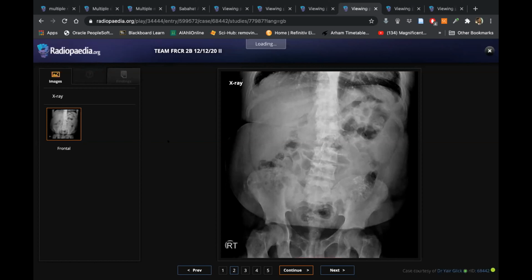I would like to correlate with whether the patient had a transplant before. No, I'm not giving you, I'm the mean examiner. I'm not giving you the history of transplant, but there's a calcific focus here in the left hemipelvis. And the patient, in the history, they told you renal osteodystrophy. So what can it be? I would assess with ultrasound to look for any calcified renal transplant. Okay, so you think it's, I cannot make any other.